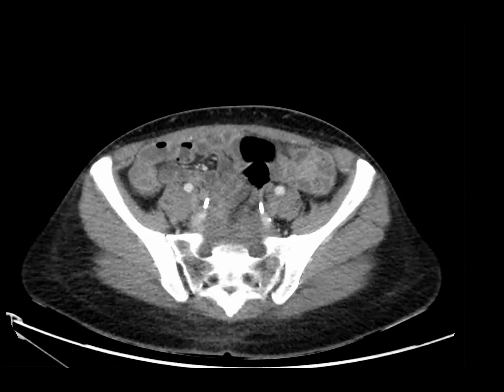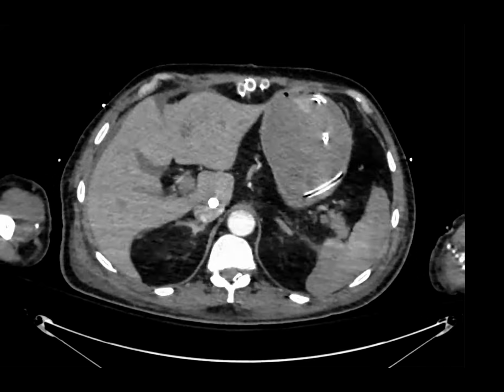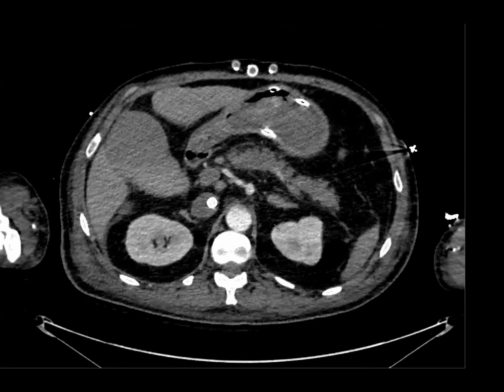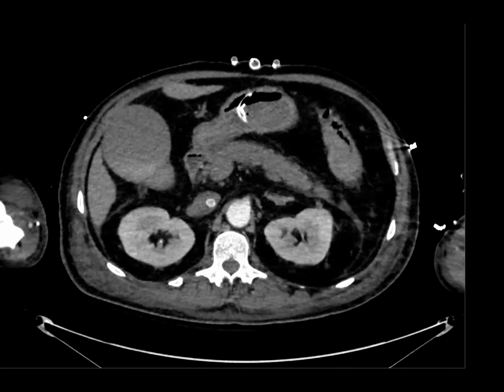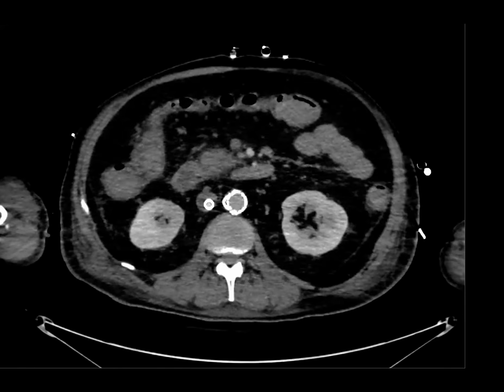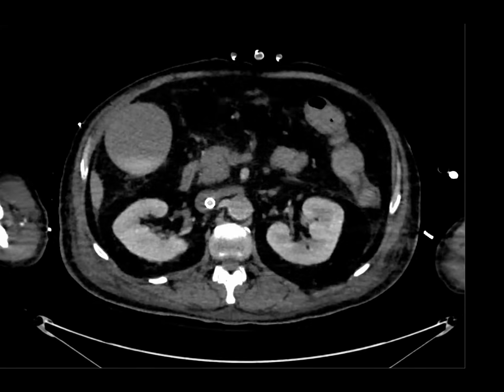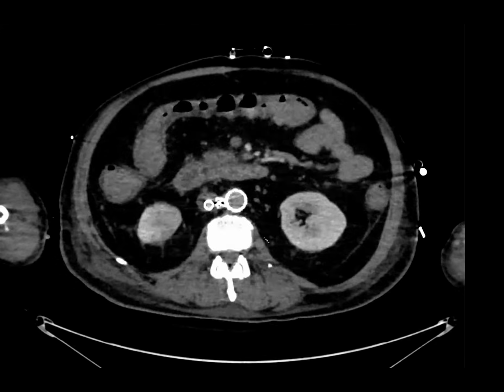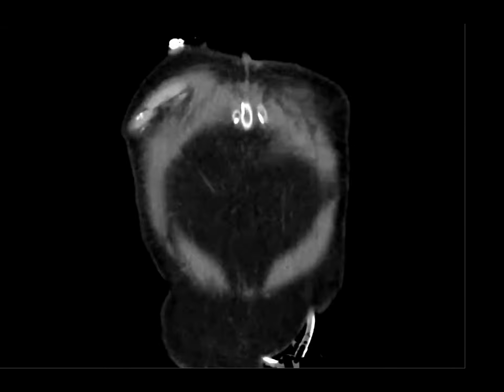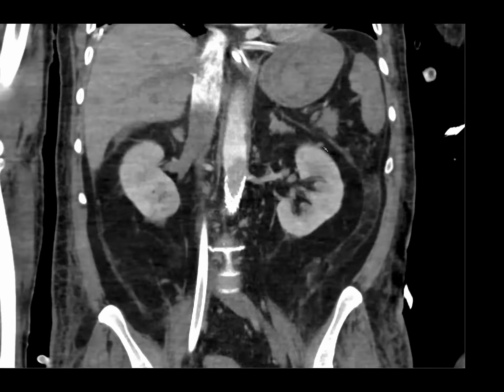So, okay, here is another case. This focuses on the aorta. So we were looking at this aorta, and then it started looking like this. And I can show you the coronal. Looks like it might be something enhancing rather than just a thrombus.